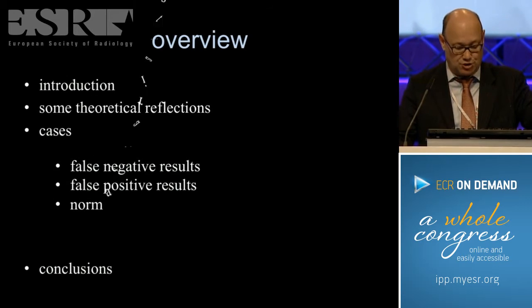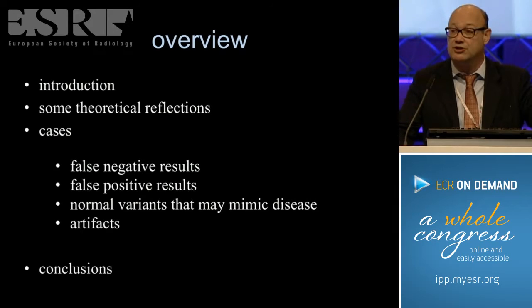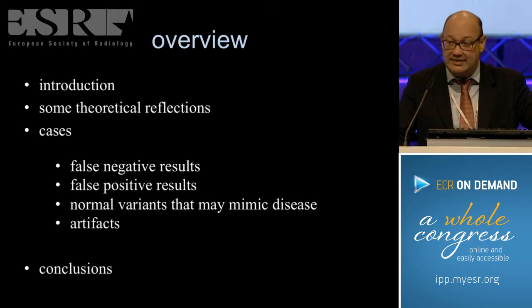Cases that will show false negative results, false positive results, and most of them because they reflect normal anatomical variants that may mimic disease, and you should be aware of and not take them for real diseases. I also will show you some artifacts that can mimic intracerebral diseases.